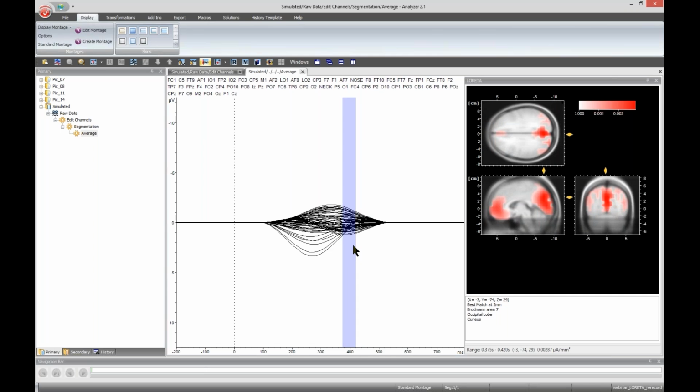Okay, so once you have this impression about the location, what you can do next is infer your region of interest. For example, from this activation map, one can already infer the region of interest to be at the frontal cortex and a second region of interest at the occipital cortex. So from this, you might then be interested to extract their respective source time series from those voxels which show strongest activation.